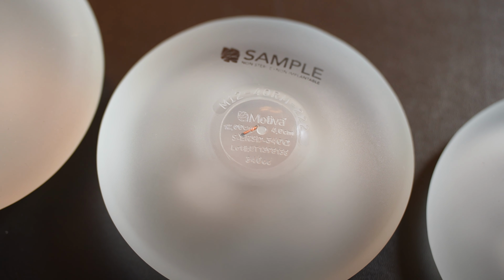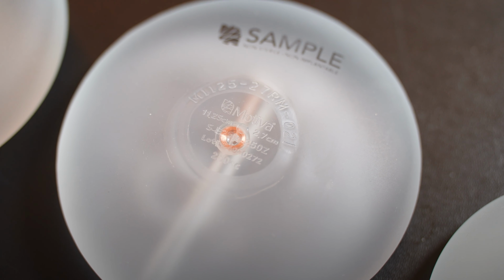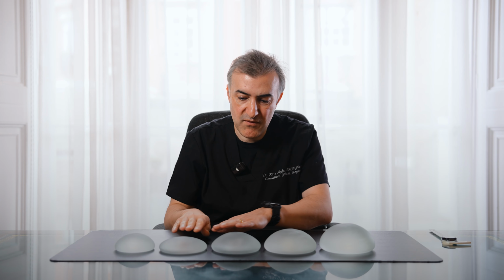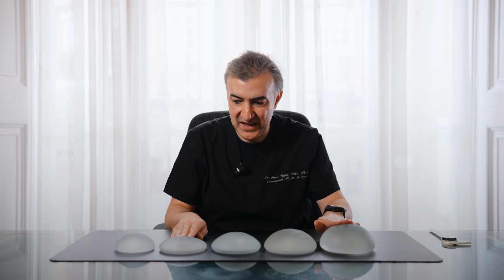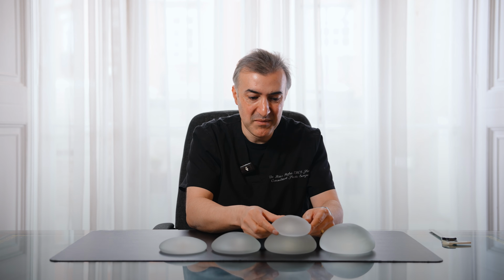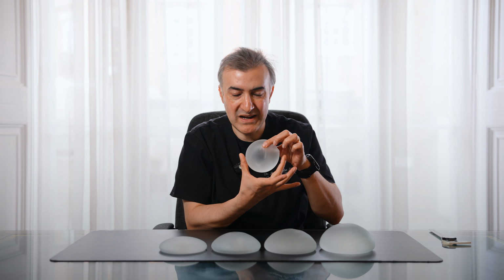In addition, you've obviously got to pick a brand of breast implants, a degree of softness, a texture, whether you want anatomical or round. And you've got 4 different projections here, and this one actually belongs in this projection, believe it or not, but it's just a lot smaller because it's more narrow.